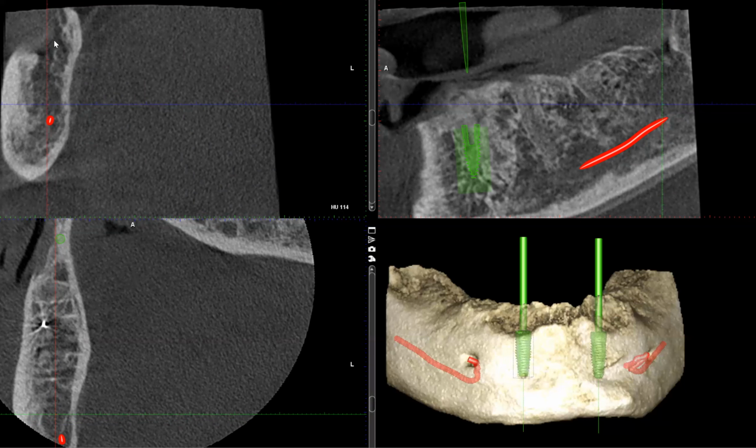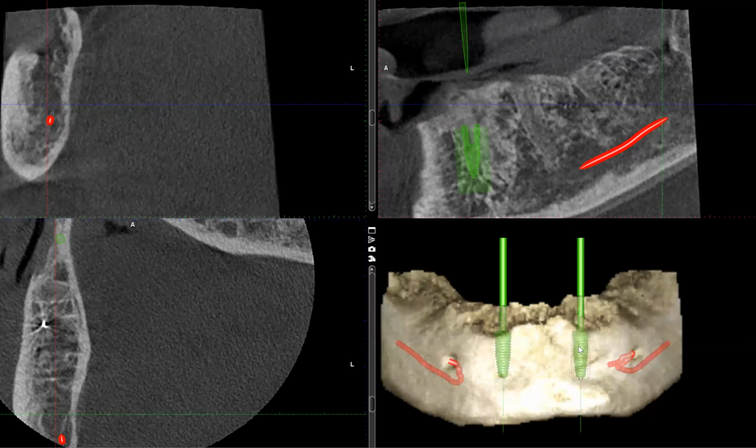If you are calling this abnormal, then you should certainly perhaps do a radiographic follow-up or order a biopsy. I think this is normal. Again, just a large marrow space. But nevertheless, I think it's important, again, to get in the habit of looking at all different areas of the scan and being able to recognize something like this. That's all I have for you.